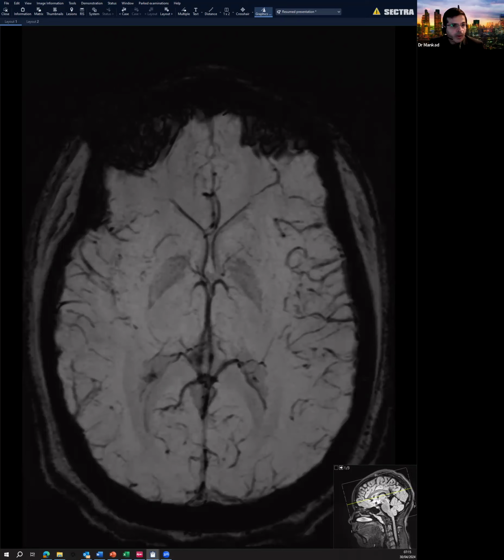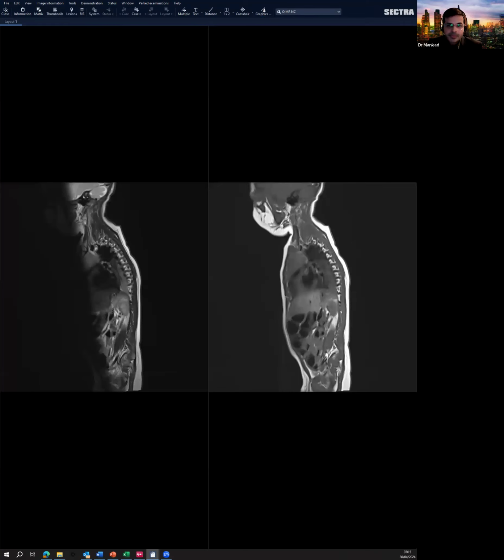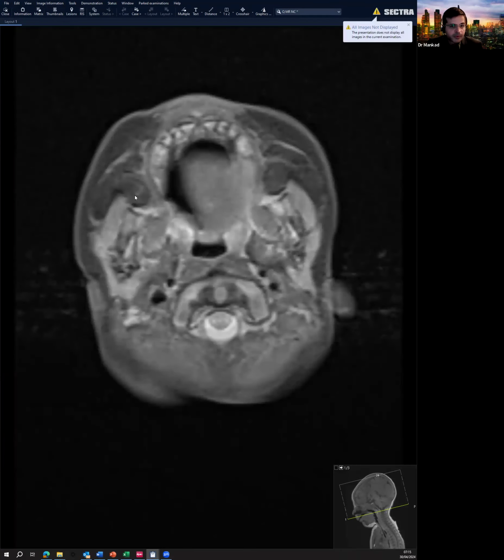Now, I did promise you that I was going to confuse you a little bit by bringing in an early brain scan from, say, a neonate. And this is my next scan here, just to show you the normal sequences. And this child was scanned for clinical indication of suspect neurocutaneous melanosis. Okay. Now, first of all, before you start seeing anything, try to remember the picture I showed to you about the T2, T1, and FLAIR. Okay. And all the rules kind of work in that very well.